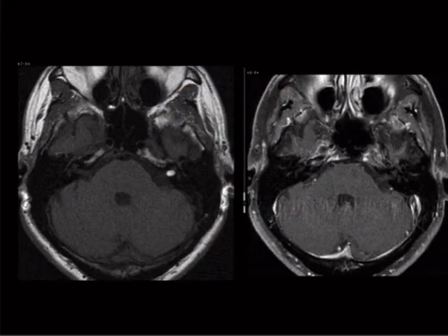So let's run through these. This is a useful skill to have. So what is this? CSF is dark, so it is a T1 probably. Now, how do you know it's not FLAIR? Because white matter should be white. So white matter is white on T1. If it's not, then it's FLAIR. So check your CSF and then check your white matter to confirm.